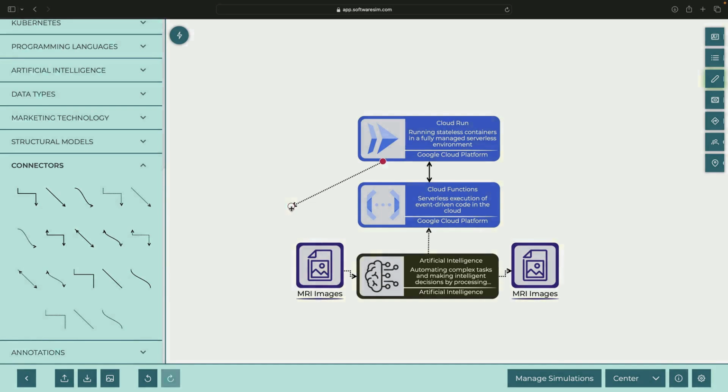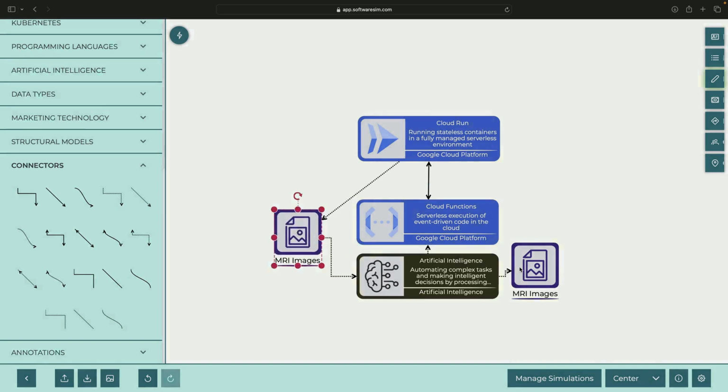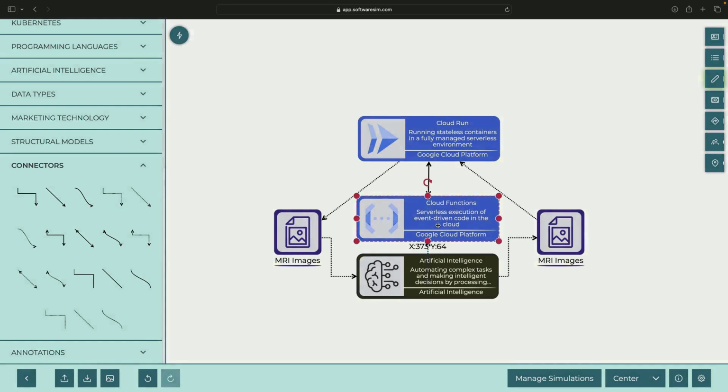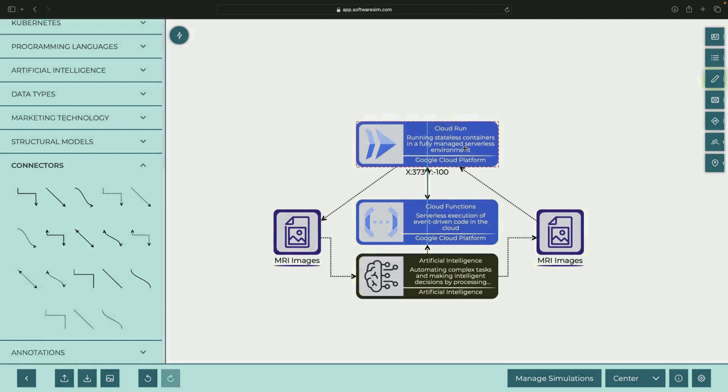First, we'll use Cloud Functions to deploy our machine learning model. The function will be triggered by an HTTP request, which will quickly load the model and return the segmentation results from a brain MRI. We'll set up a Flask web server that interfaces with the Cloud Functions API and displays the prediction in a user-friendly way.